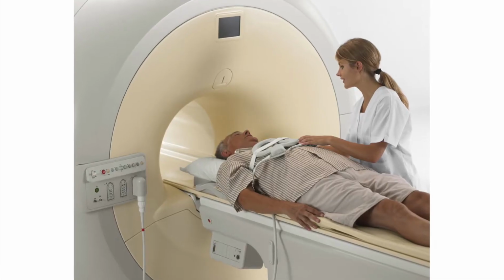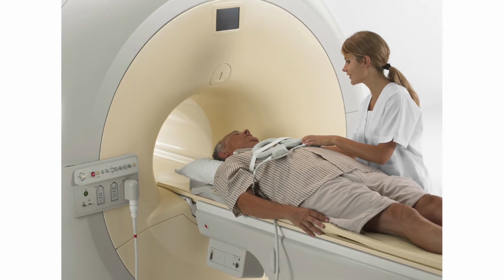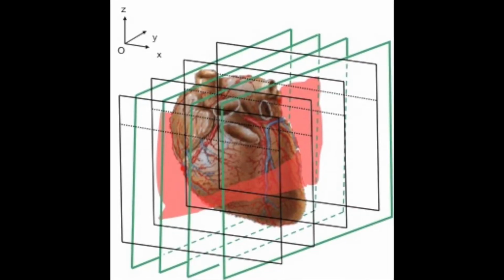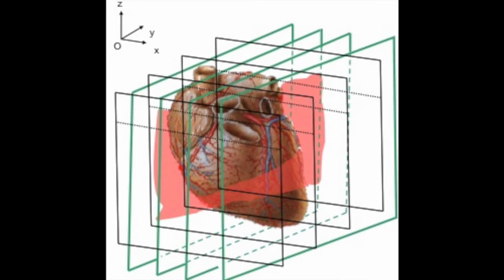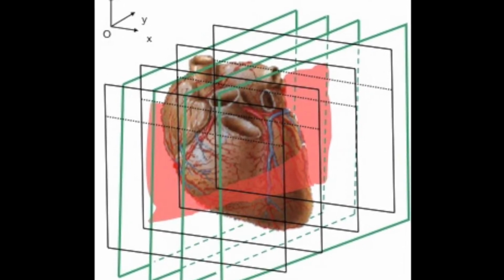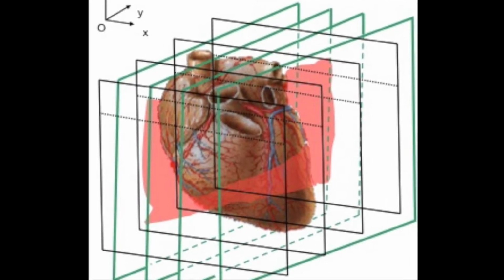CardioWise analysis starts with image sequences from one of 25,000 standard MRI systems installed worldwide. Image sequences employ a standard technique known as radiofrequency tagging, shown in the diagram as green and black intersecting planes. The short axis imaging plane is shown perpendicular to them.